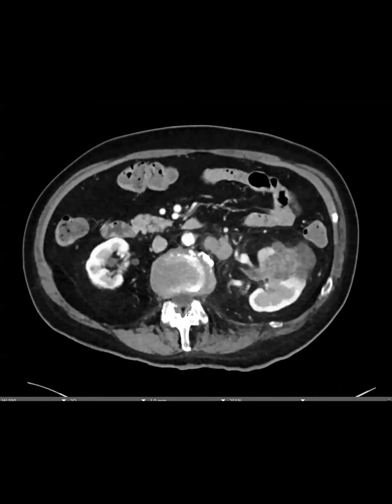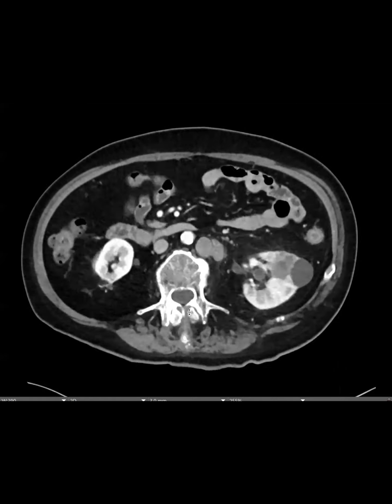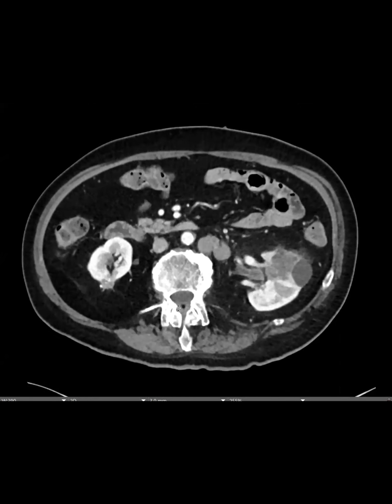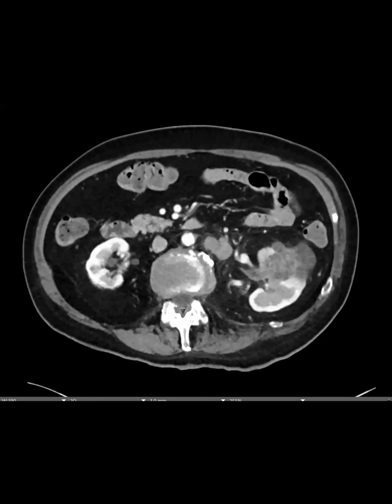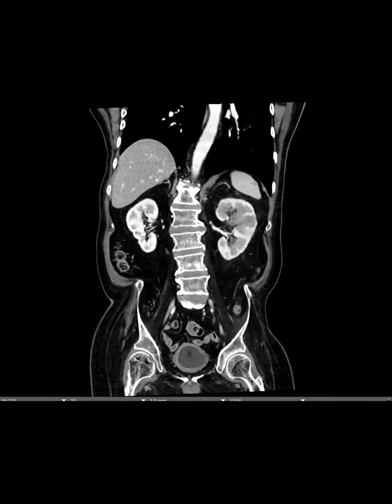But this is later. Oh my gosh, what's going on now? Yeah, what's going on now? So I'll say that the patient did not get the follow-up that was recommended for several years, and then presented with hematuria. Yeah, well now it looks like there are huge solid components. Carcinoma, yeah, with metastatic adenopathy.